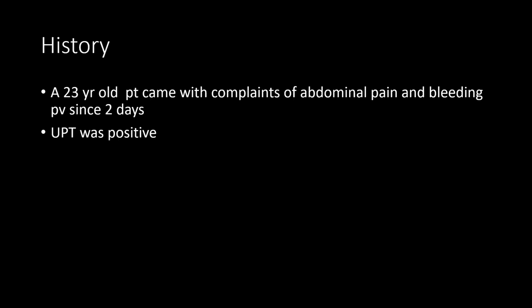Today I'll present an interesting case. A 23-year-old female patient came with complaints of abdominal pain and bleeding PV since 2 days. A UPT was done for the patient and it was positive. The case was referred to us from the Department of OBGYN for USG pelvis.